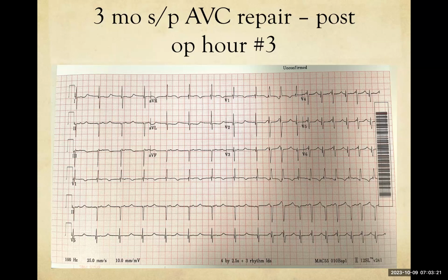Good morning. Let's see. So looking at the left, the lead 2 is sticking out to me, where you're seeing the QRS and then what looks like either your T and U wave, or is that a P wave?